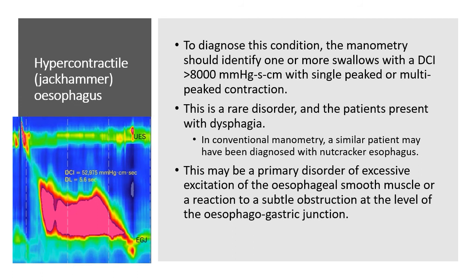This may be a primary disorder of excessive excitation of the esophageal smooth muscle or a reaction to a subtle obstruction at the level of the esophagogastric junction.